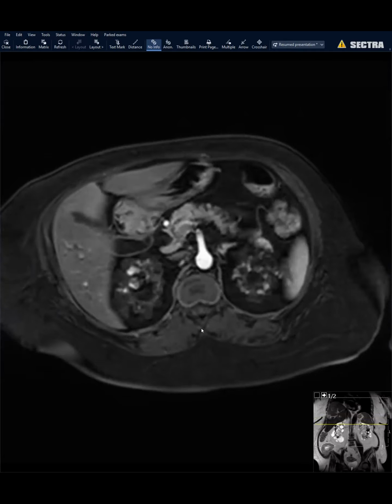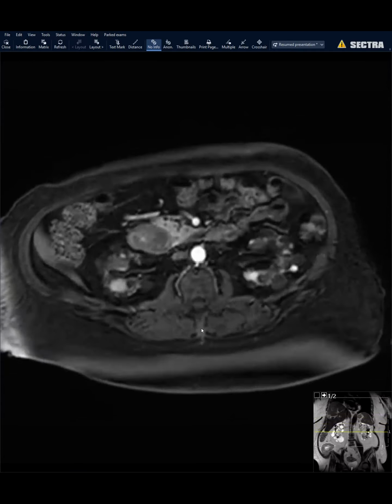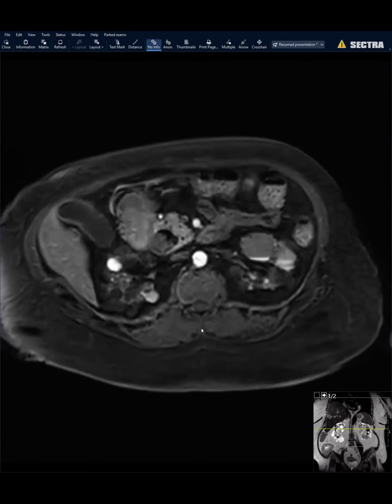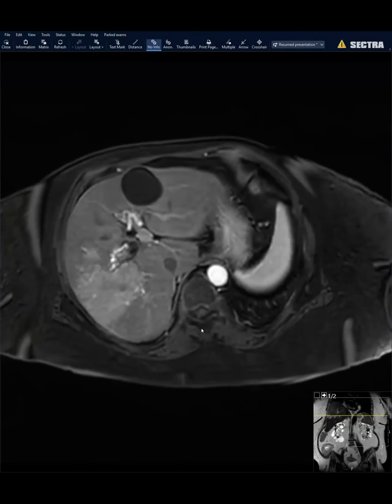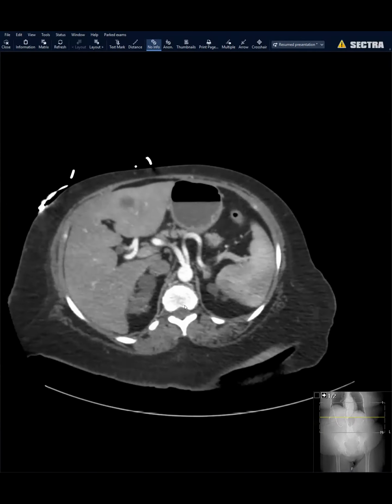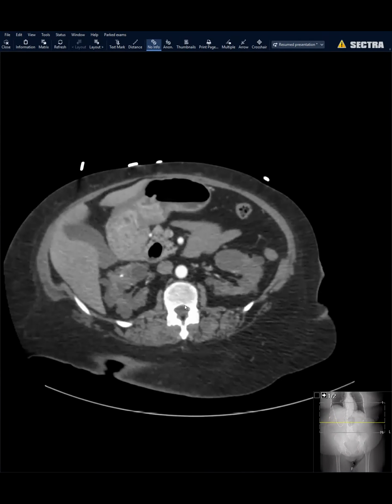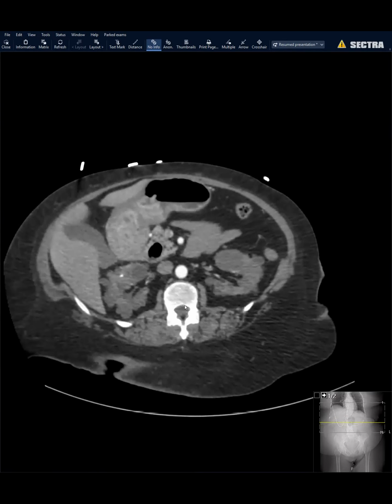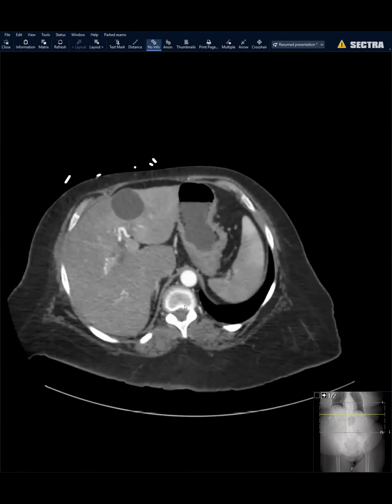Oh, wow, look at that. There's all this enhancement. So the post-contrast helped us some. And then here was a CT done just a few days ago. So, and the antrum looks bad. So is this like PTLD, or that definitely would be considered for me?